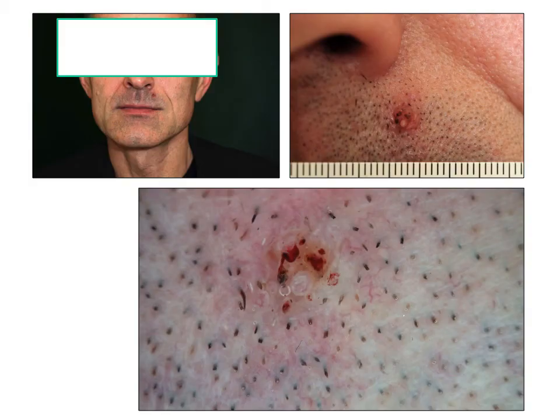But in very small lesions like in this one, it is possible to recognize the vessels of the papillae right in the center that give interesting information in favor of a keratinizing tumor, and why not a squamous cell carcinoma.